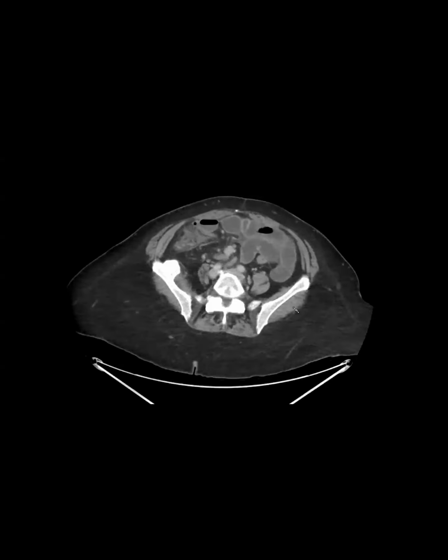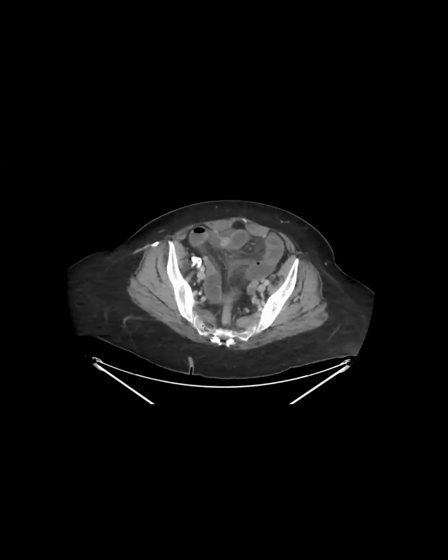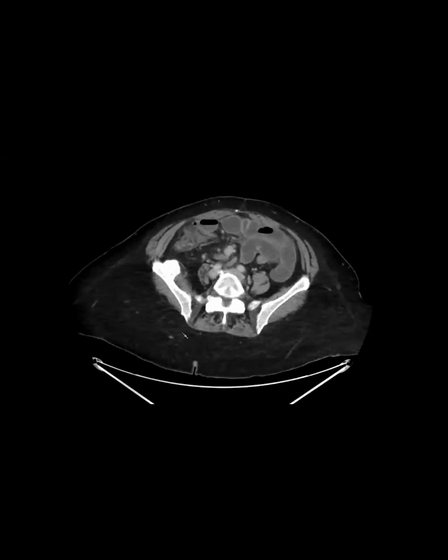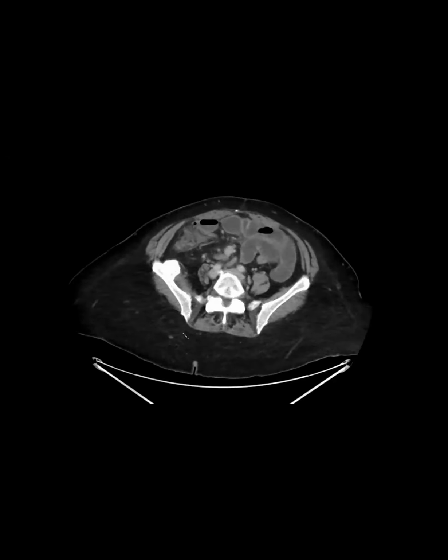One is on this image, a bony lesion from the right iliac. Oh, nice. That's not the lesion I'm talking about, but maybe there's an osteochondroma. And then there's another finding here, and it's not part of that bony lesion. But okay, the main extra lesion, I'm going to scroll through it back and forth here.